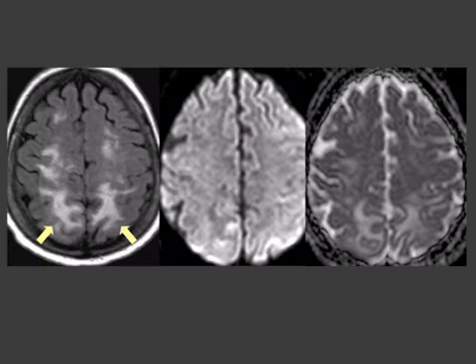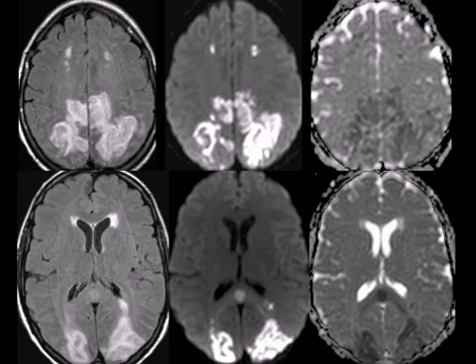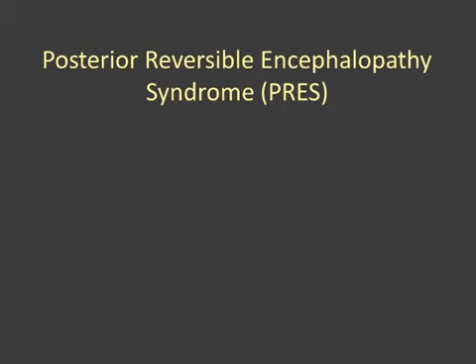This is PRES diagnosed very early. Bilateral changes with elevated diffusion, meaning nothing on a trace diffusion and high diffusivity. This is PRES diagnosed too late, when we already have a cytotoxic edema and changes. This patient will definitely have changes in the affected brain area. So this was a bit too late.